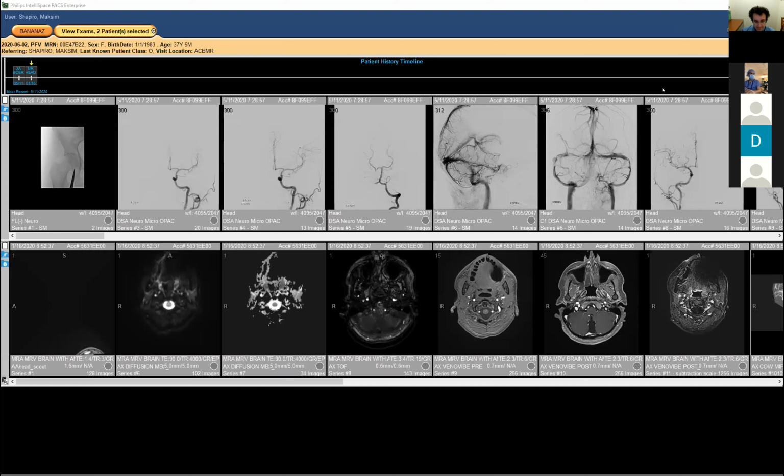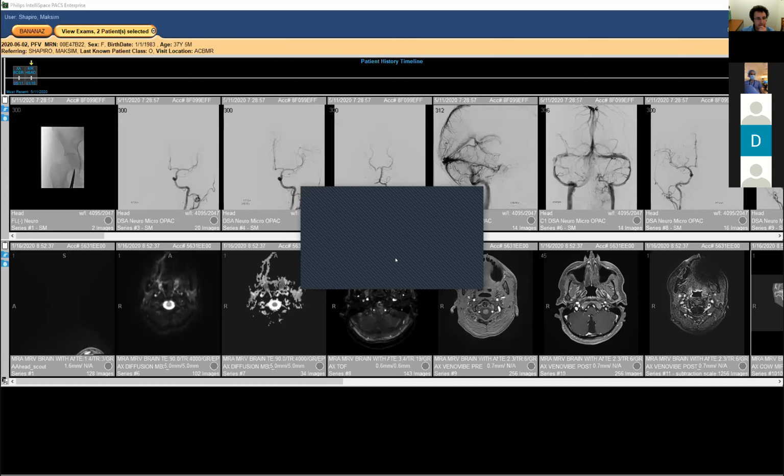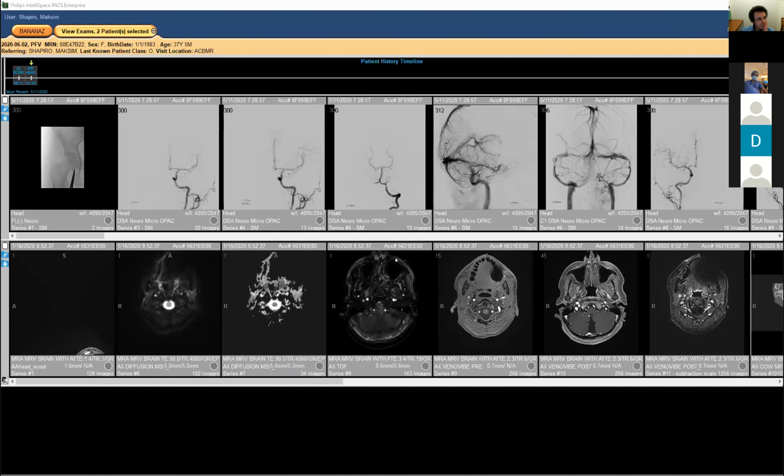So the question I think you are very eruditely asking is, is that venous structure, which is straight and flat, a typical meningeal vein, or is it an unusual venous structure, as Eitan is suggesting, perhaps in between the leaves of the tentorium, that distinguishes it from a usual meningeal vein, much like the medial occipital sinus up there on the screen right now, which is not consistent.